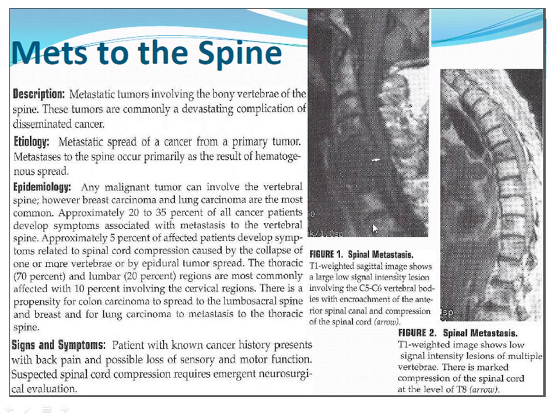If a tumor is in the vertebral bodies itself, it has a chance as it grows to extend posteriorly into the epidural space and cause really significant cord compression. It can extend into the paraspinal muscles and that kind of thing. So the contrast helps you determine the extent of the soft tissue part of the lesion. Obviously, we can see the bone part of the lesion pretty well without contrast, but the soft tissue is an important thing to characterize as well.